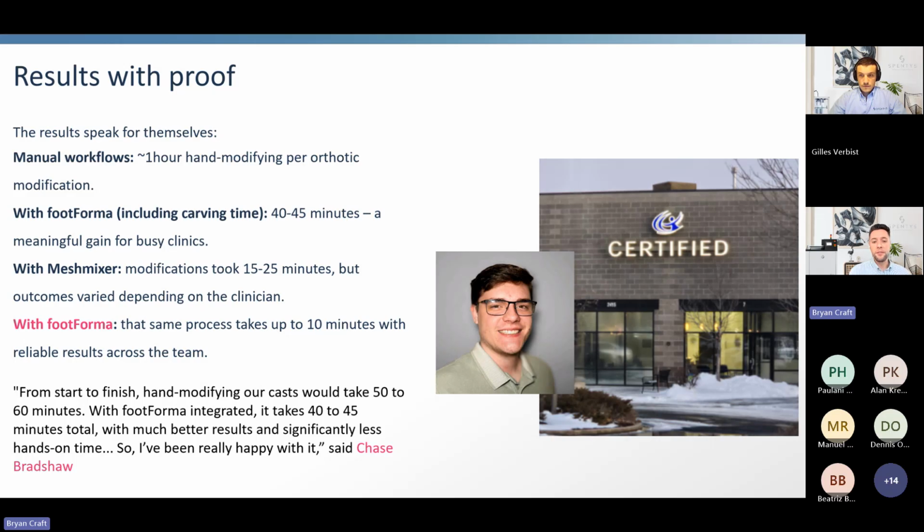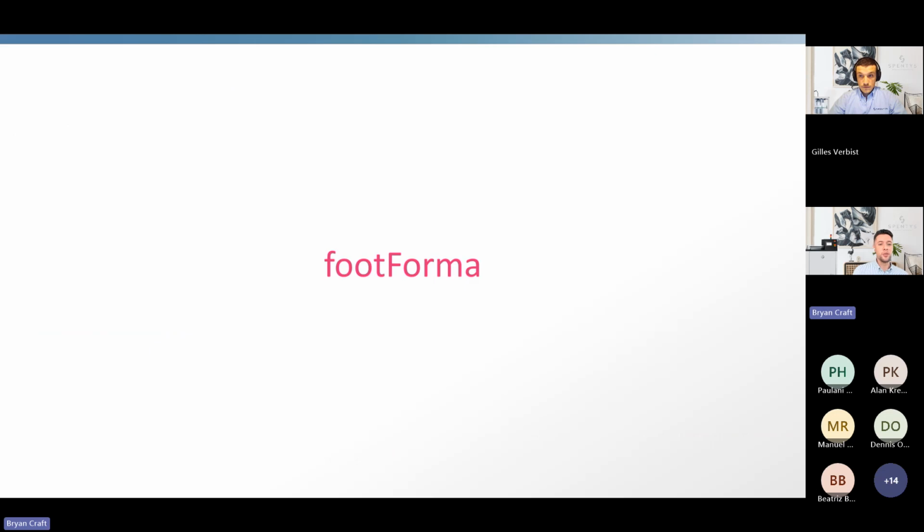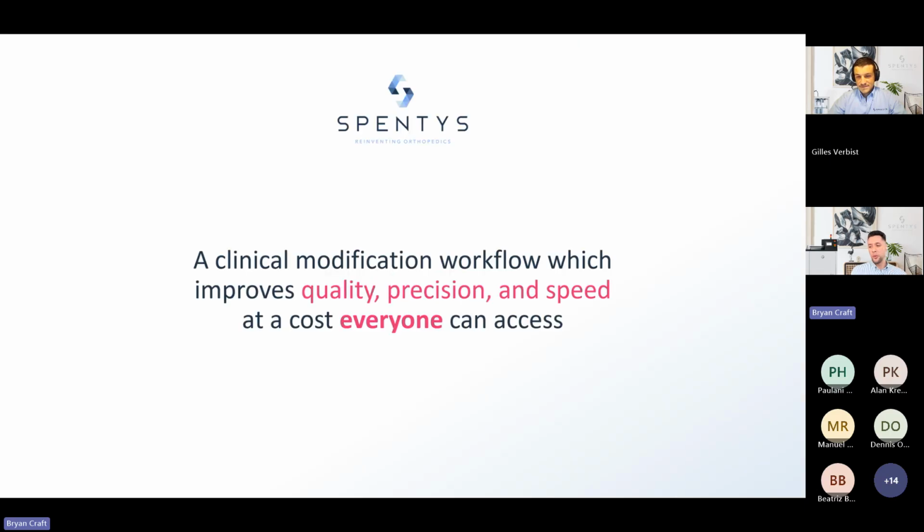So we're very proud of how Certified has been one of our early adopters of this workflow and is producing hundreds of molds a month. And we are thrilled to share their experience with the tool. But I don't want to spend all day talking through slides and going through word for word the core value proposition. I really want to show you, with Gilles opening up footForma and driving the process himself, so you can actually see and experience it for yourself.